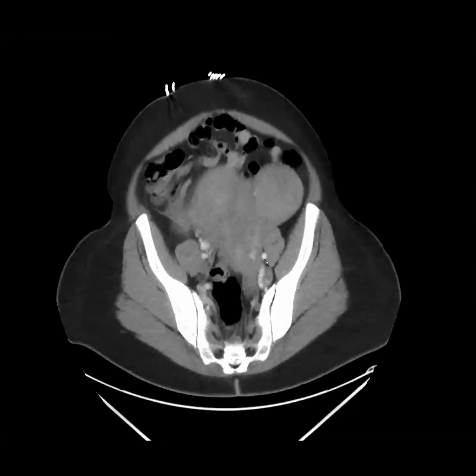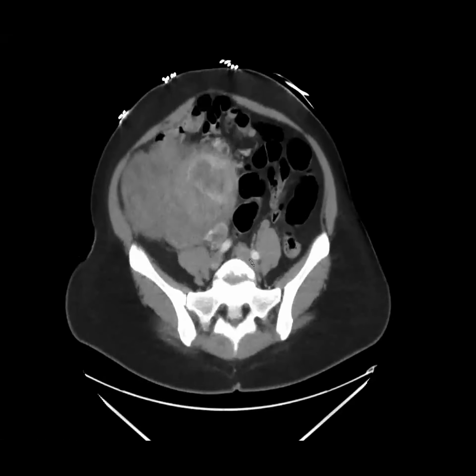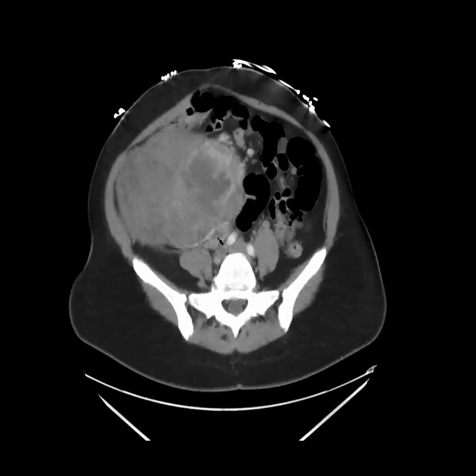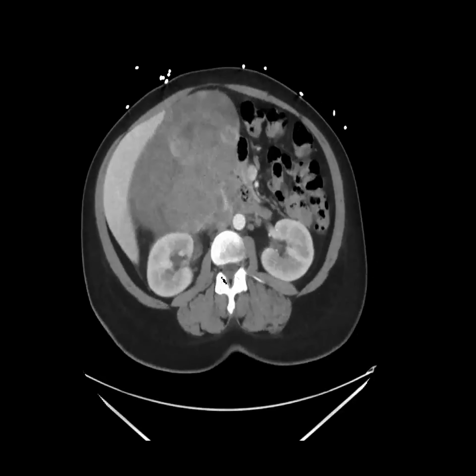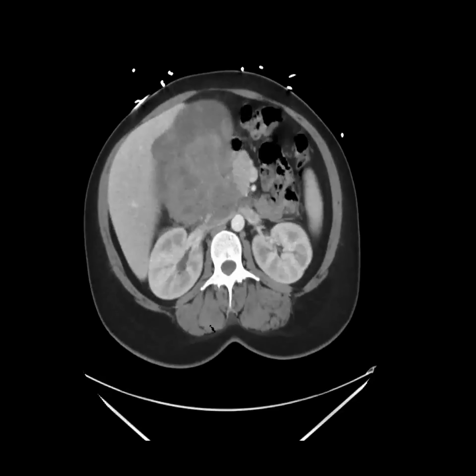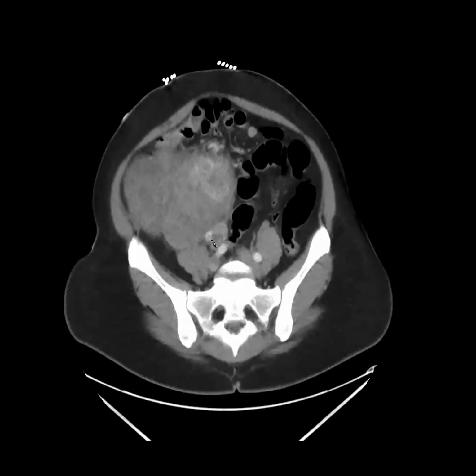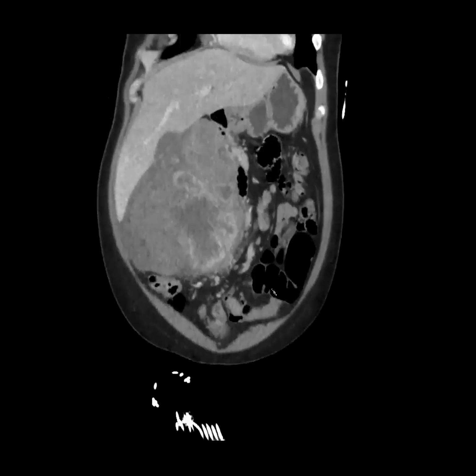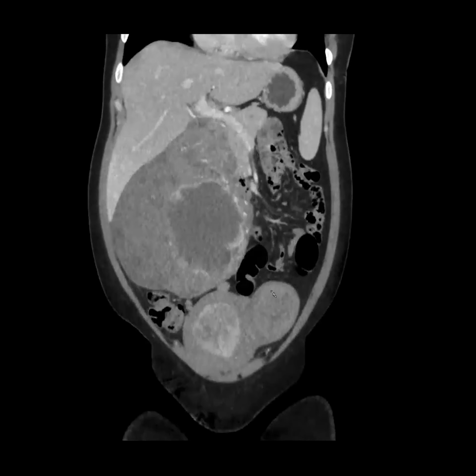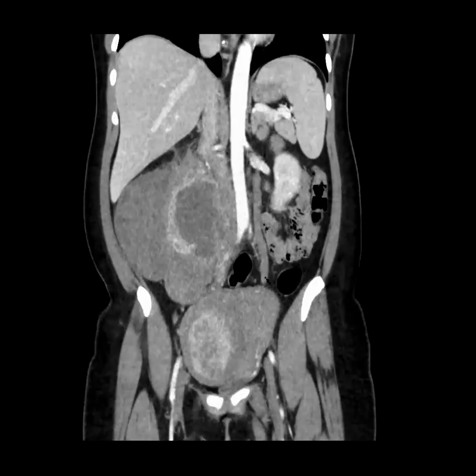And it looked like there was something in the gonadal vein here, as well as up here, something in the IVC here. So do you guys favor this to be a fibroid, a pedunculated fibroid, a parasitized fibroid, a leiomyosarcoma? What do you guys think? I think you've got to worry about malignancy on this one. Yes.